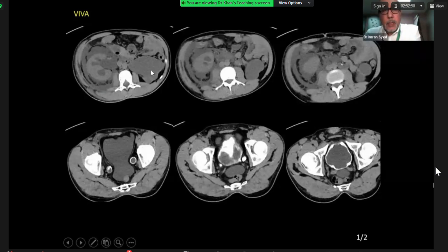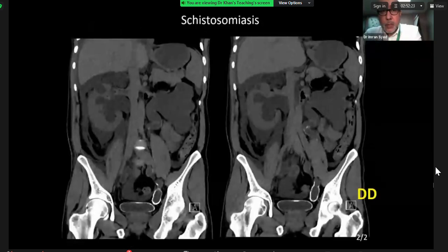There is a burnt out left-sided kidney, as you can see, with no renal cortex there. And within the pelvis, there is circumferential calcification of the distal ureter with luminal and wall calcification noted. Further south, you've got significant chronic bladder wall changes with thickening, with calcification of the bladder, which again is circumferential, and the features are entirely in keeping with schistosomiasis, as you say.